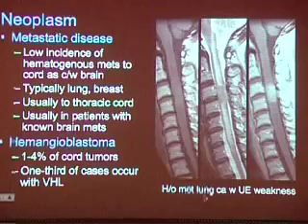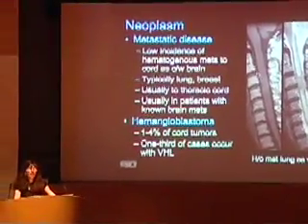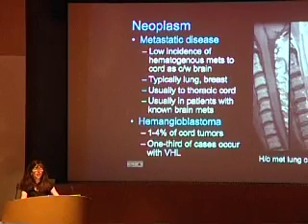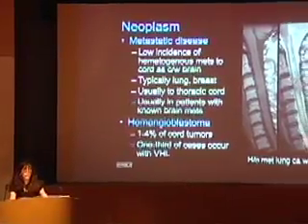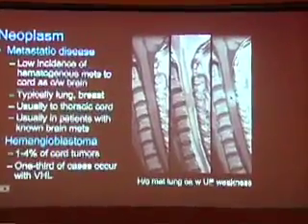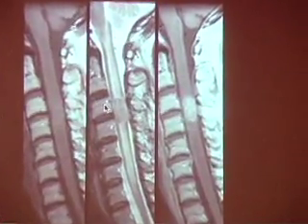And here's an example of a patient with a history of metastatic lung cancer, known widely metastatic disease, who presents with upper extremity weakness. And your first thought would probably be that the patient has a bony met and either foraminal or cord compression. But in this particular case, we see that the cord is fat. So we have an intramedullary lesion. On the T2, you see this intermediate signal intensity, highly cellular lesion with major cord edema extending away from it. Post-GAD, we have fairly homogeneous enhancement in a patient with metastatic lung cancer to the cervical spinal cord.